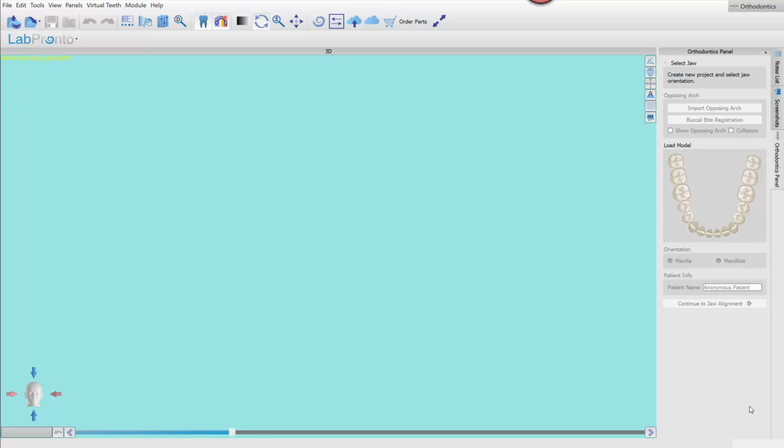This first video is going to be the initial setup to the point where we do the alignment, and that will be the end of this video. Hopefully it's something you can play while doing your first few setups, so you know the general workflow without having to see videos that go over every small detail.